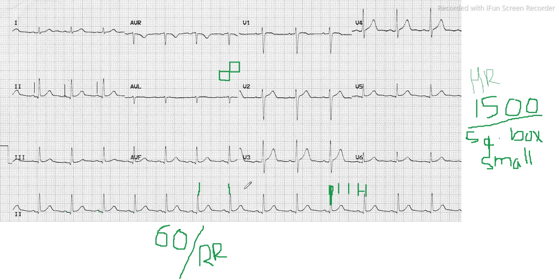So let me quickly erase all these things. Now what we will be talking about is looking at the individual waves. To find the P wave you look especially at lead 2. The P wave morphology looks normal, and for the QRS complex, you can compare V1 and V6. In V1 there is negative deflection, which is a normal phenomenon, and the magnitude is also normal. In V6 it is positive deflection and the magnitude also looks normal. So there is no sign of right ventricular hypertrophy or left ventricular hypertrophy.